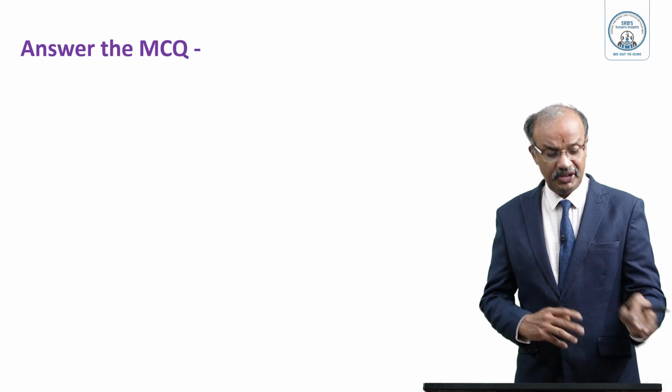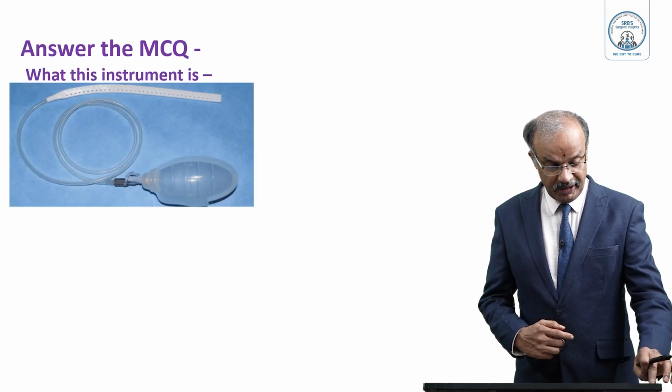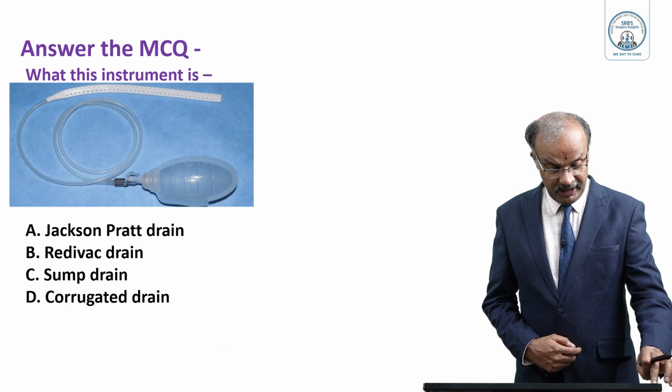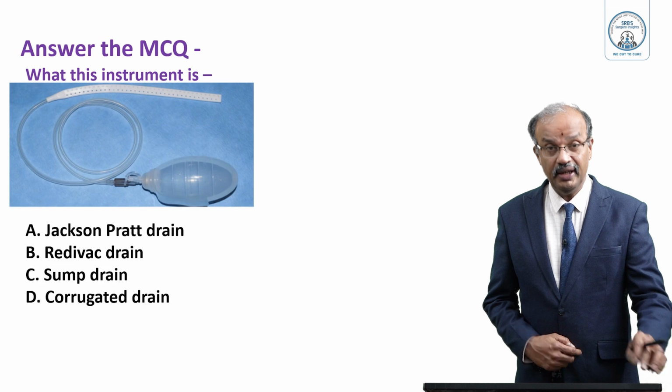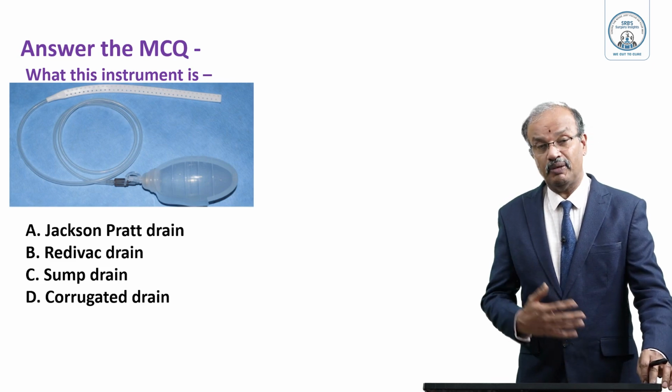So students, answer this MCQ. What is this instrument? Look carefully. A. Jackson Pratt drain, B. Redivac drain, C. Sump drain, D. Corrugated drain. Put your answer in the comment box. We'll have a discussion about that once you put it in the comment box.